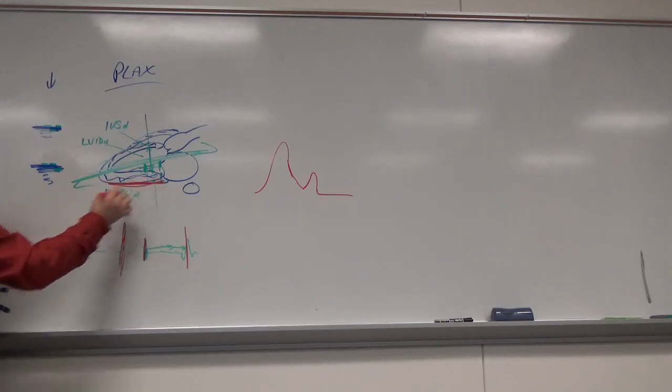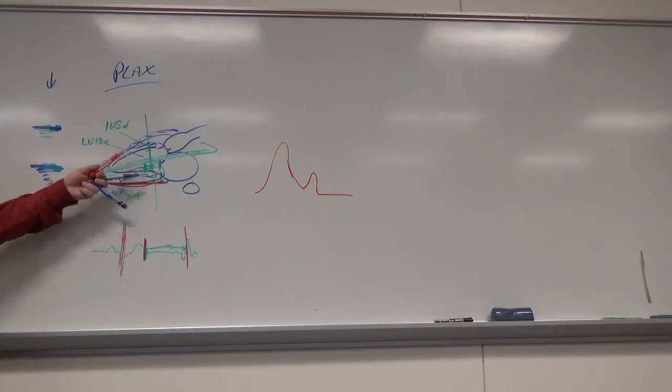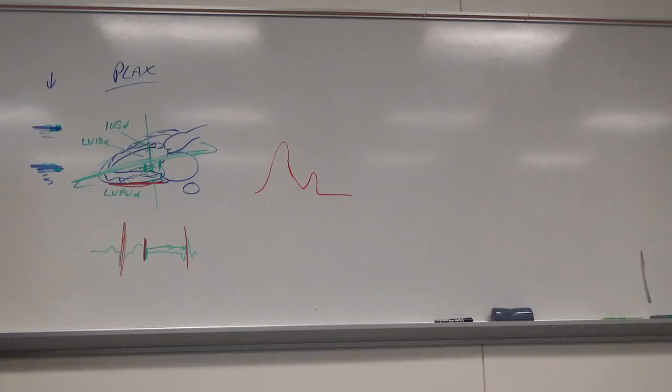Okay, that's what I was confused about, because you said leading edge to leading edge, so I wasn't sure if on the interventricular septum it was the far leading edge to the internal leading edge. Yes. So on an echo, this is actually good. The wall is going to look fairly gray, like a consistent gray.